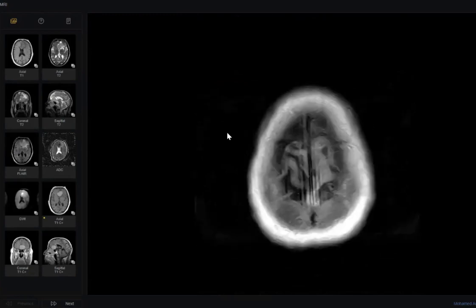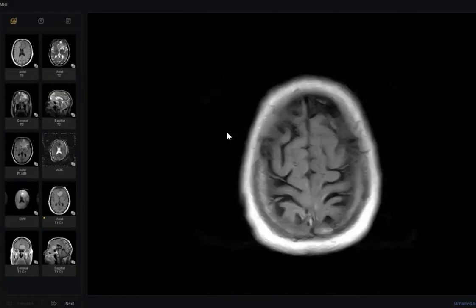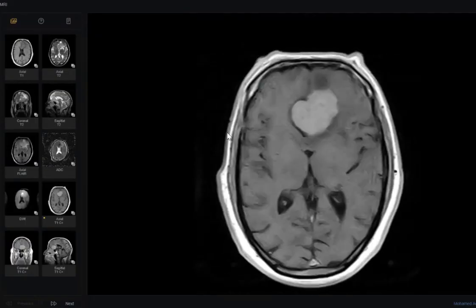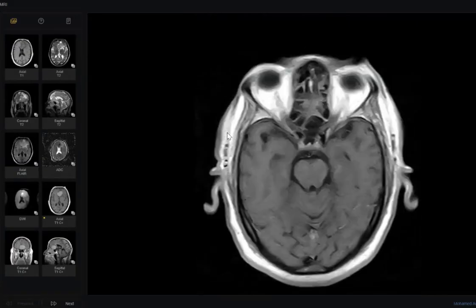Okay, so I cannot see any other enhanced lesion. What's your final diagnosis? So this is a case of meningioma. I would like to compare with the previous images for interval change in size. Doctor, could you remember the history? It's chronic headache. Sorry, I forgot it.